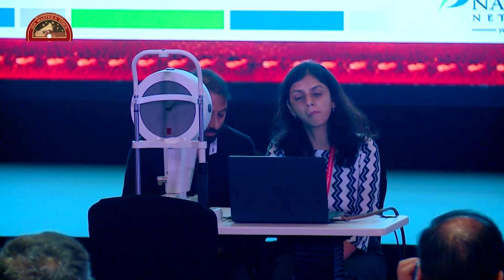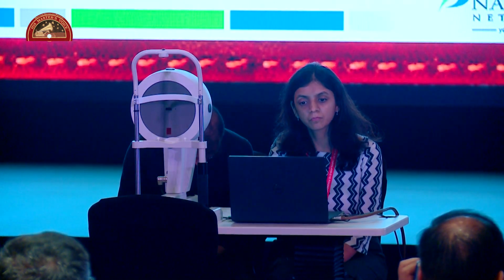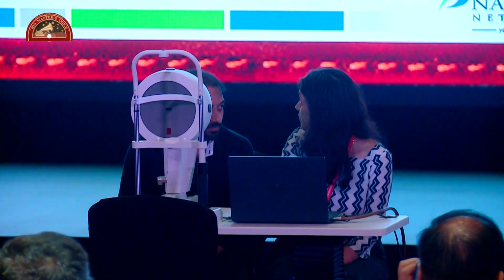So we know that Pentacam is useful for regular astigmatism, which is with the rule, against the rule, or oblique, or anything. But anything which is irregular, we know that a toric IOL may not be the best scenario. So when we look at using toric IOLs or multifocal IOLs, topographers are a must, and we do not have an alternative to that.